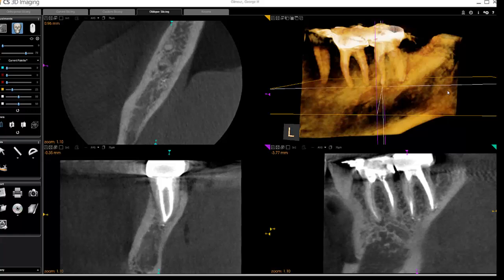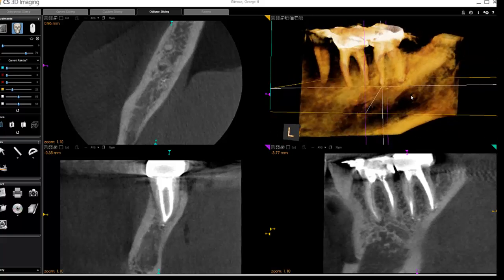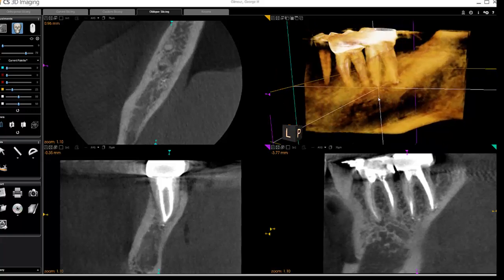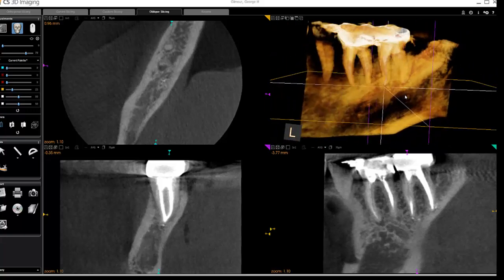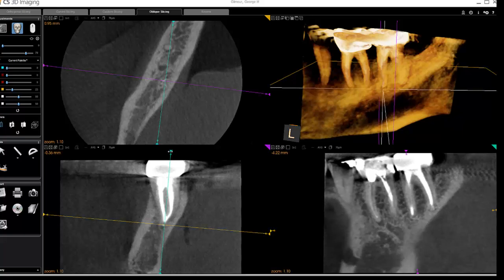So I'm going to start off by showing the 3D scan. You can see these two molars, the lower second molar that I had treated in 2006. You can note the periodontal bone levels are fairly normal. On the lower first molar, there is a furcation defect. The patient isn't having symptoms with the tooth, but there is some progressive periodontal bone loss, and it's not quite exactly healed. Now I'll show you how I examine a tooth when I recall it, when I very meticulously look at it in 3D.